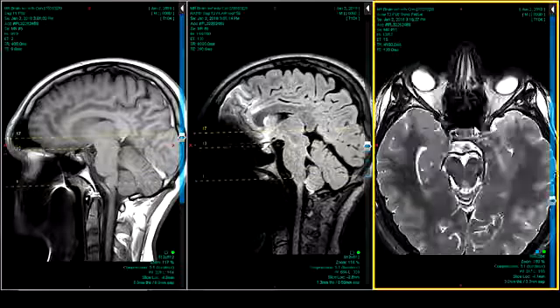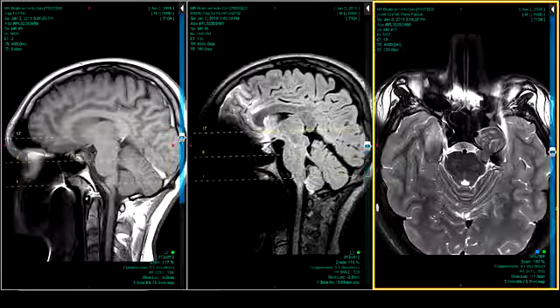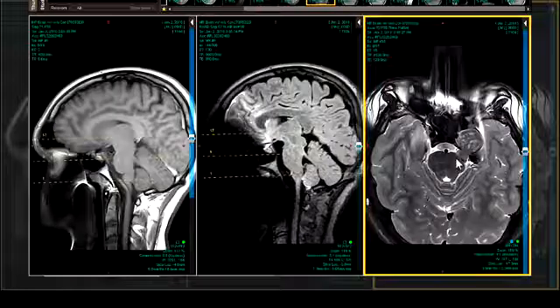Okay, so there's 6th nerve palsy. Whenever the complaint is of a nerve palsy, someplace in my report I try to follow the whole course of that nerve, and say, for example, the bulbopontine fissure, in this case, and remember that it crawls up the clivus in Dorello's canal, and then into the cavernous sinus, most medial, in the cavernous sinus. So on this side, it would go this way.